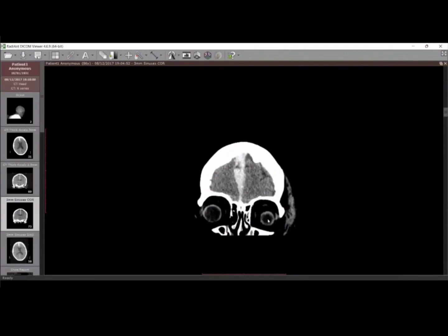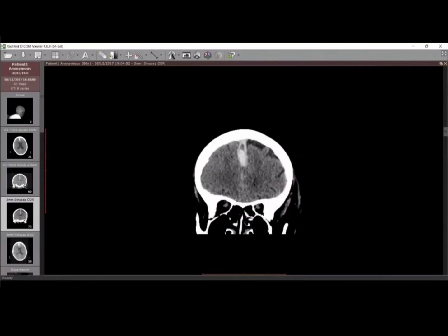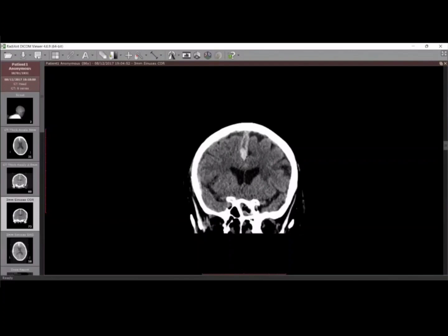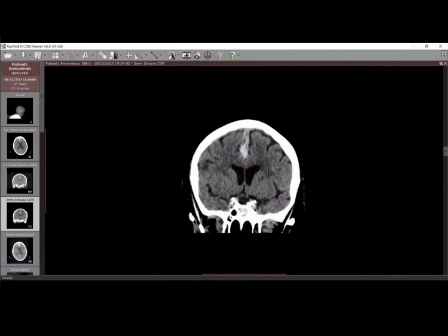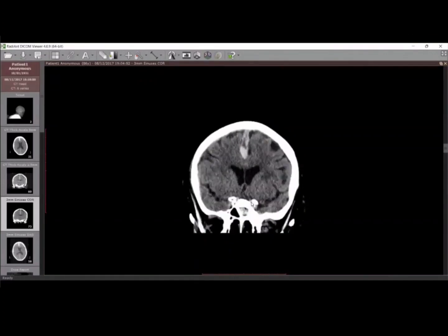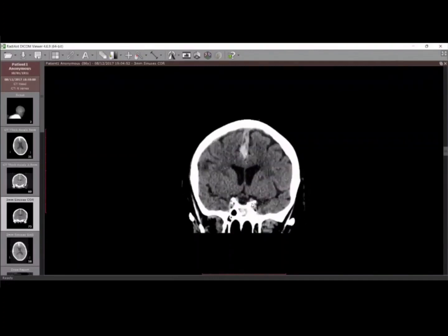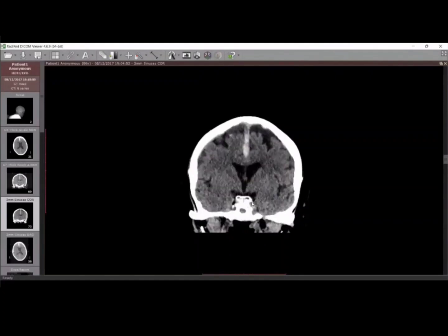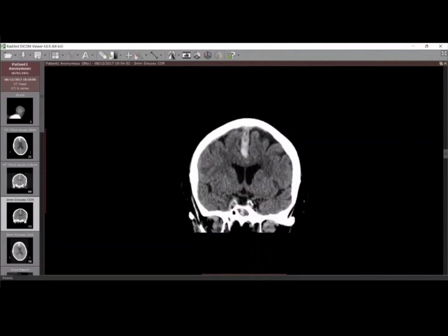So now with this history, I'm concentrating on the left optic nerve and the pathway. So this left optic nerve, this is where I'm pointing. Don't worry about the optic nerve. Anything else? I'm trying to look if there is any effacement of the suprasellar cistern or in the region of cavernous sinus, some mass effect which would explain the diplopia.